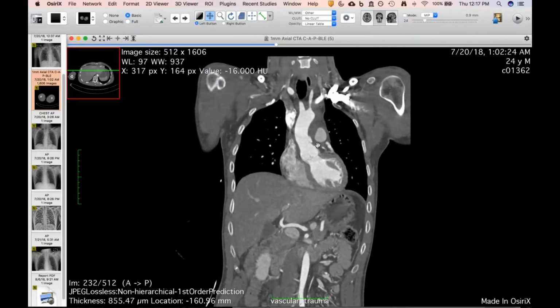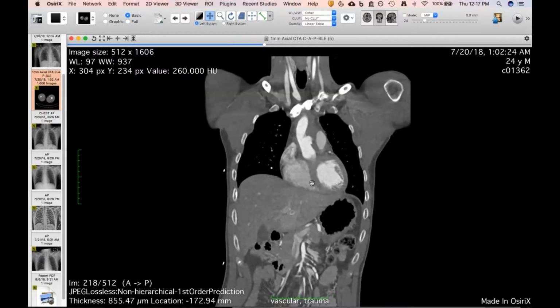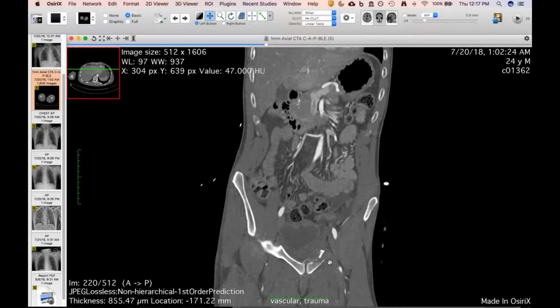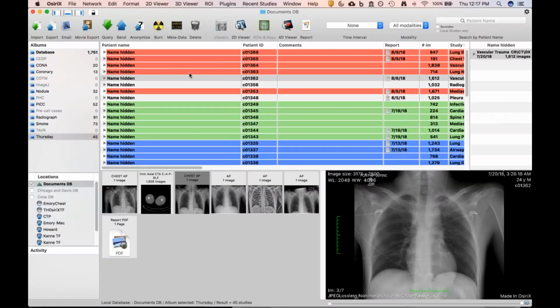Wow. And this is one of those ones, probably if they'd let it go, if he lived that long, you never know. Maybe this would have healed and calcified, and you just see a chronic calcified traumatic aortic injury in the future. But this guy was obviously lucky in this sense, not other parts of his body. I think on the CT, now that you mention it, Seth, I think he had pelvic fractures, he had a bladder rupture, he had a bunch of lower extremity injuries as well. So that's what they attended to first.